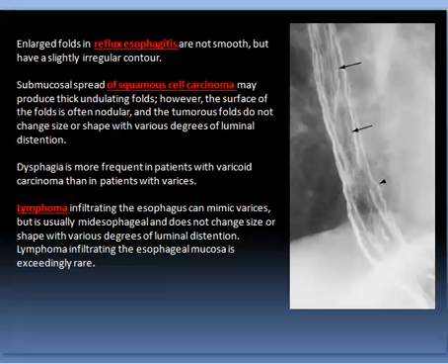So this appearance of reflux esophagitis, with esophageal mucosa appearing thickened, could also be due to creeping mucosal carcinoma, submucosal carcinoma, or creeping lymphomatous infiltrations along the esophagus.